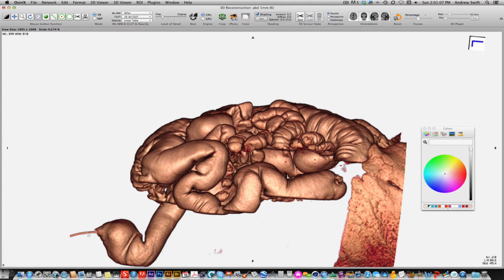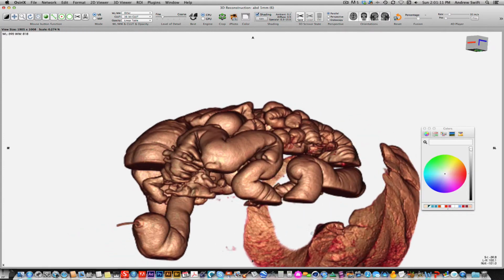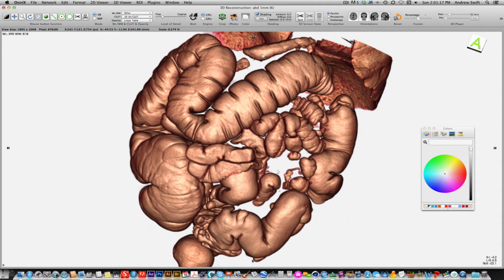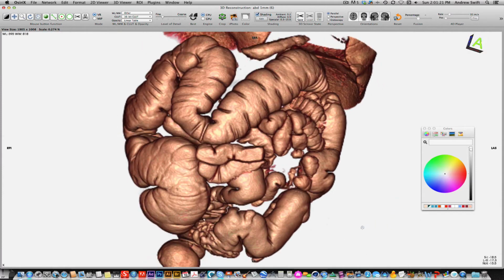So this must be air inside the scope, the edge of the lungs here. It's really a neat data set. And we're going to do the same thing next where we fly through this. And so there's a little bit of air left in the stomach. I hope this person was unconscious for this.